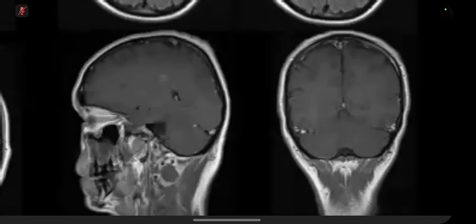Then comes the role of diffusion weighted sequence. Please remember that active plaques of MS can show restricted diffusion. Usually, initially, it will be bright on DWI and low on ADC map, but within 2-3 days, it might change. The ADC might become isointense to the parenchyma.